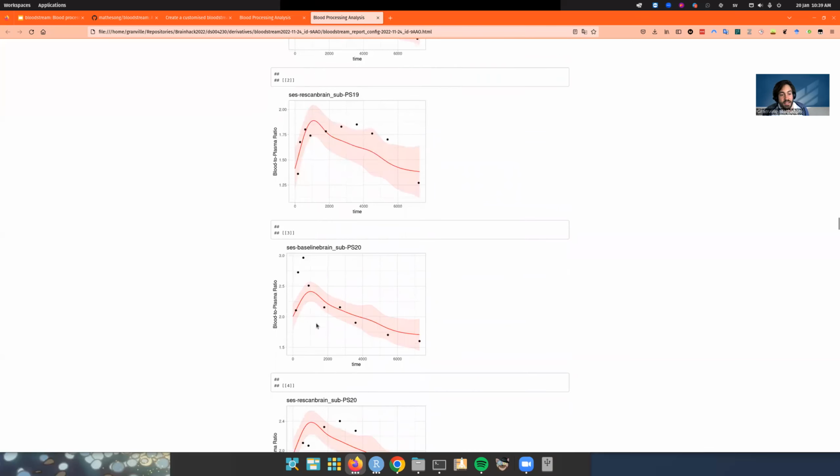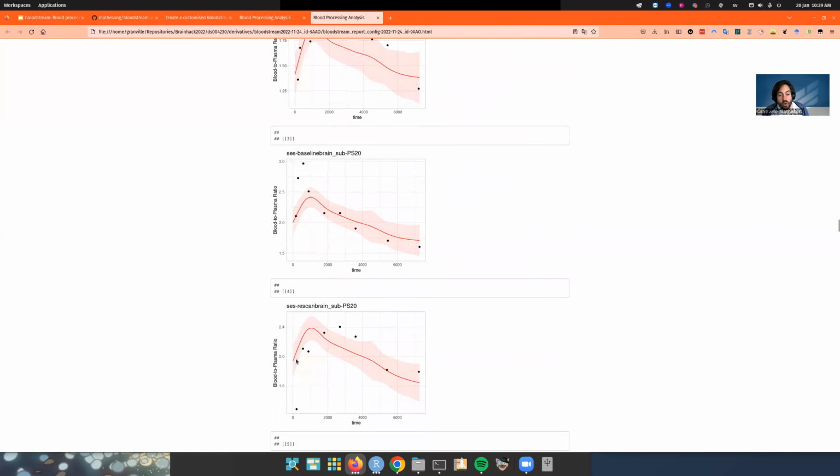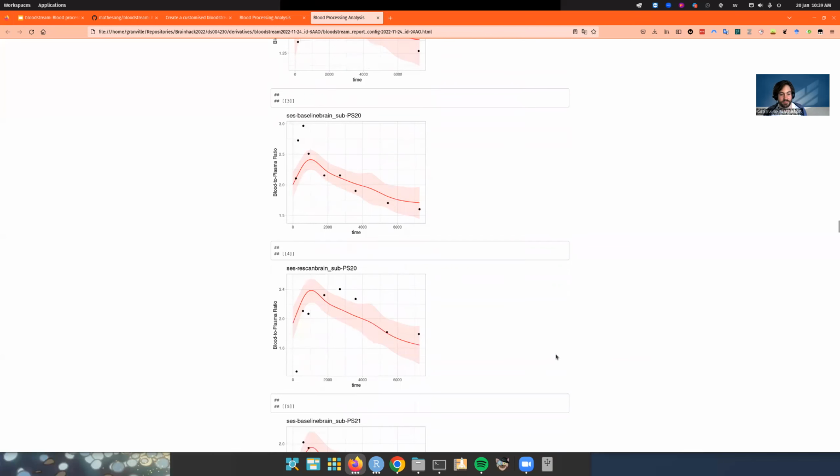So basically over here, our model has said, well, because I have this function on PET2, probably these values are a little bit too high and we don't need to go all the way up there. So it's learning across the data sets what it anticipates. And similarly, this value over here, based on PET1, it's saying, well, you know what? This is unlikely to be a true value. I'm going to only go this far down.